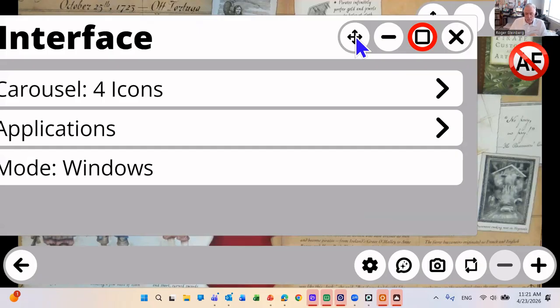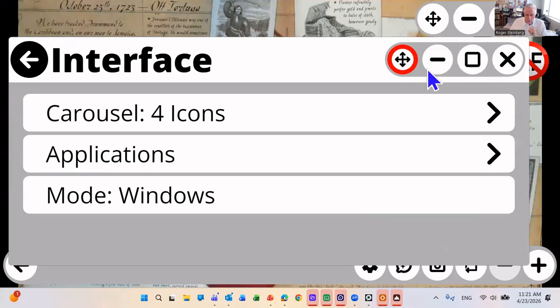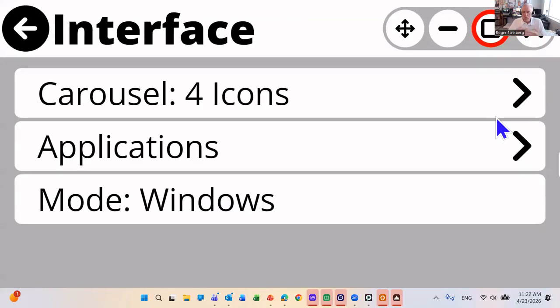And you can't see 100%, but I have three monitors going. I'm taking it off to another monitor right now, and I see what was beneath it, which actually the magnifier app is running underneath of it right now. And then there's actually a minimize option there as well. So I can just minimize this to my taskbar and come back to it later. So if I go back to the square and click on it, it will again resume full size on the screen. And I am in Windows mode right now, so I see my full taskbar at the bottom down here, so I can go and open any of my Windows taskbar.